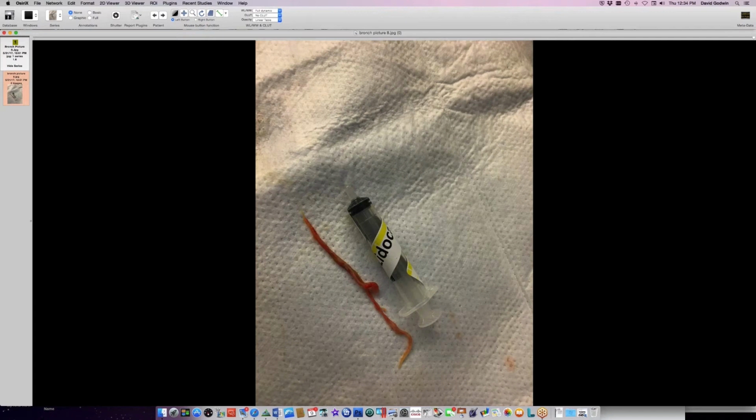So plastic bronchitis here. That's pretty cool. Yeah, David, I came across a case report, I don't remember how old it was, of a kid who had lymphangiectasia who got better after diagnostic lymph angiography, and the thought was the Ethiodol caused some kind of lymphosclerosis, like you alluded to. Yeah, I think that's what they were hoping for here, and maybe she did get some treatment effect from it, but the definitive procedure was not done. They were going to do some coiling, but they never got in. Maybe she will have success at an outside institution.